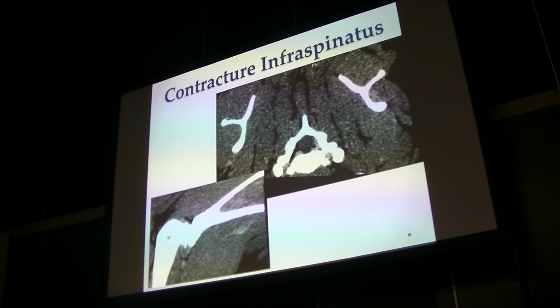We immediately see the muscle atrophy. There's less muscle present in relationship to this image, and after IV contrast, in CT we use a lot of IV contrast as well, we could pick up the hyperdense contrast enhancement of the tendon and at least the muscle at that area. It's the muscle where pathology is going on.